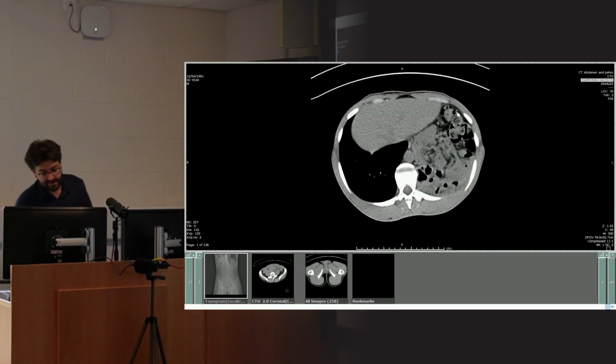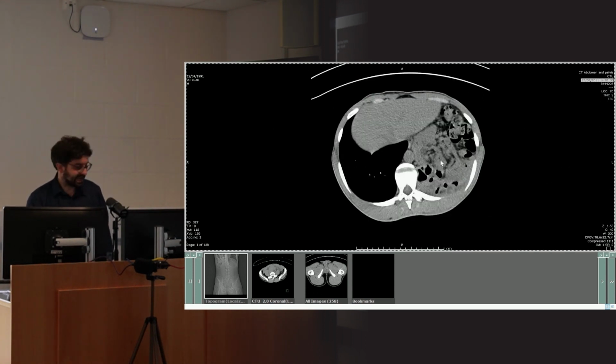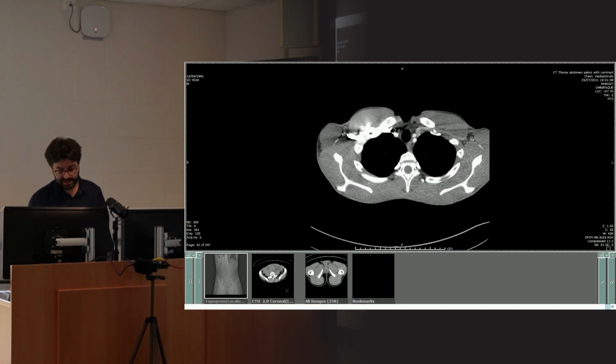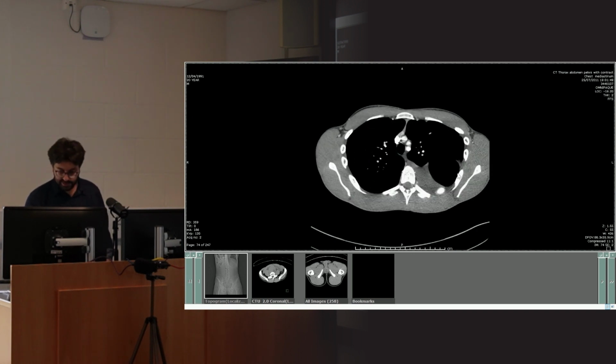So we were like, okay, well, let's now give some contrast. And also something weird going on in the chest too. So we gave contrast, and we did a CT chest up the pelvis. Clearly, this isn't renal colic. So what do we have here?